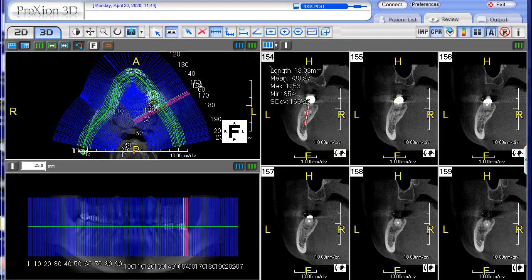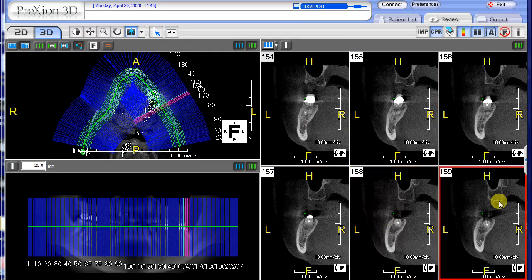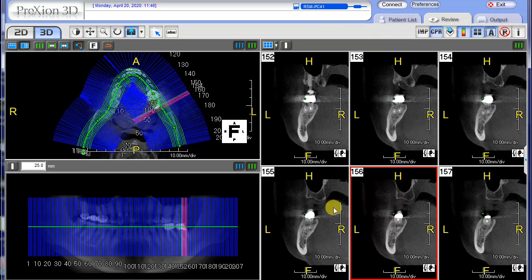For your cross-sectional images, your measurement tools are active here. I just measured a distance as a demonstration. Remember, pick any frame on the right and just click once and roll the wheel back and forth, and you'll notice the lines moving as a sequence.